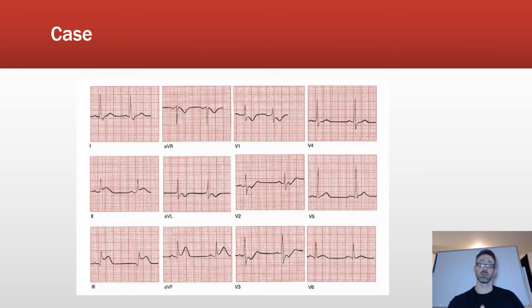And I apologize, in the previous example, I didn't look for any Q waves, which we should have done. So if you have the time, go back and see if you can find Q waves. But be careful with the Q waves. Remember, we usually have normal physiologic Q waves, which you can usually find in those left lateral leads, particularly in V5 or V6.